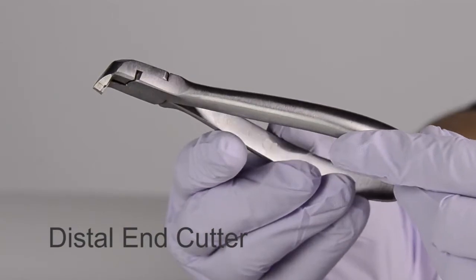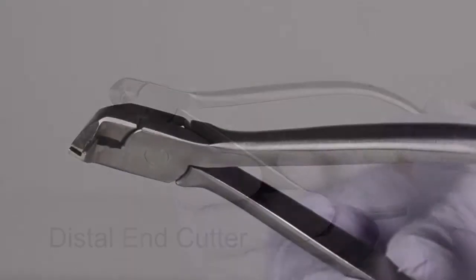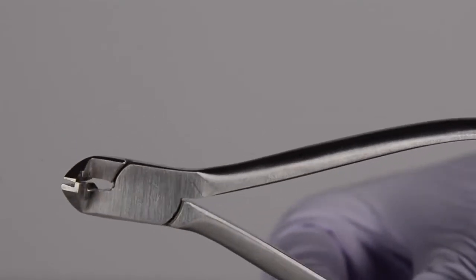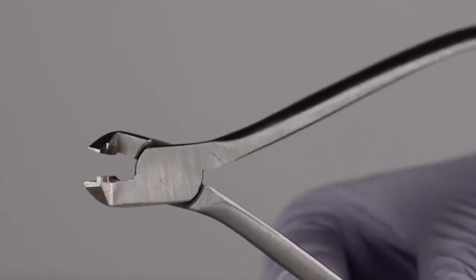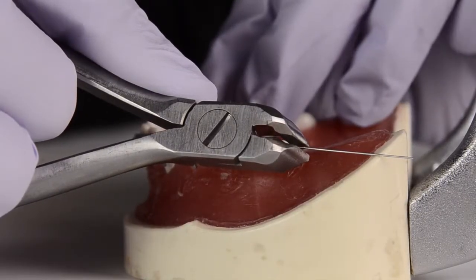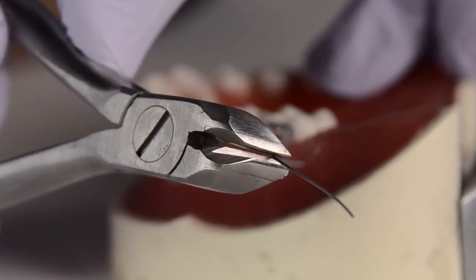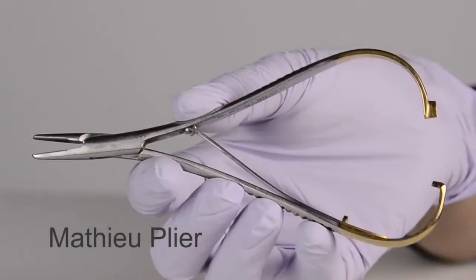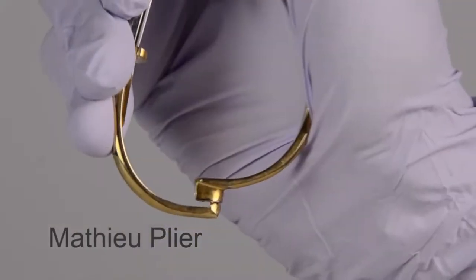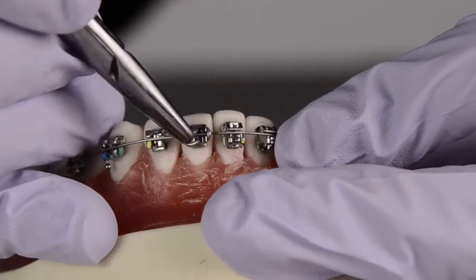Distal end cutters have two cutting surfaces at right angles to the long axis of the instrument. These are used for intraoral cutting of the terminal end of a ligated arch wire. They will also catch and hold the cut end of the arch wire, thus preventing the loose end of the wire from injuring the patient. The Mathieu plier has a quick-release locking and unlocking mechanism, which is used for the placement of elastomeric ligatures.